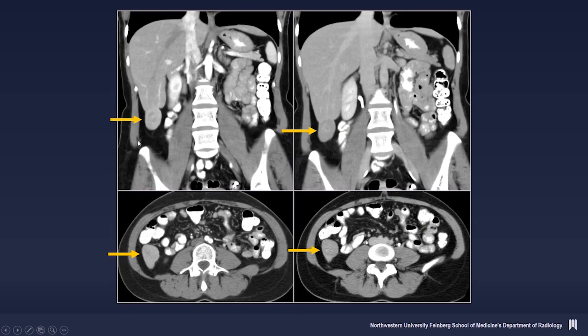Another example, in this case, I thought it was helpful to use that hepatobiliary agent because on the CT it looks fairly nonspecific. You might even question, is there a central scar that's enhancing or not, but certainly not clearly having a central scar.